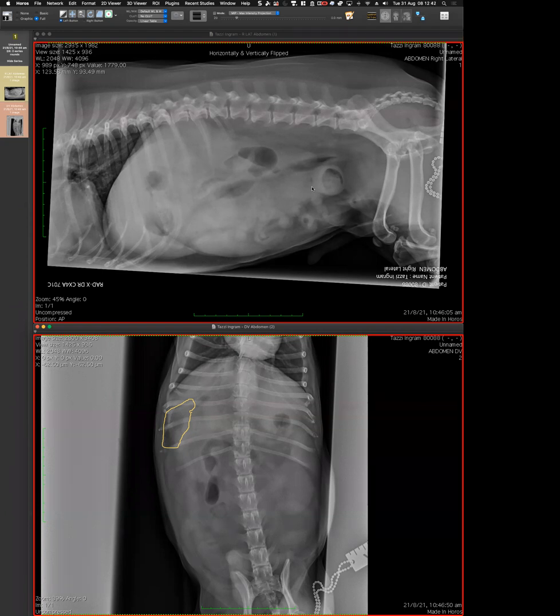Okay, so I keep writing, and then hopefully we have people adding or disagreeing or bringing more stuff, and then once we have all the ingredients of the salad, then we mix the salad. Okay, so I'm kind of waiting. So for now we have the liver is okay, the spleen is kind of okay. Maybe some of the borders are not that well defined.